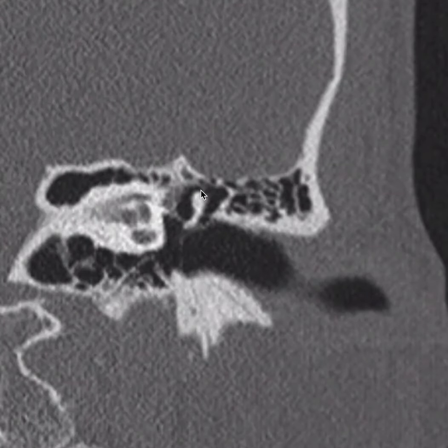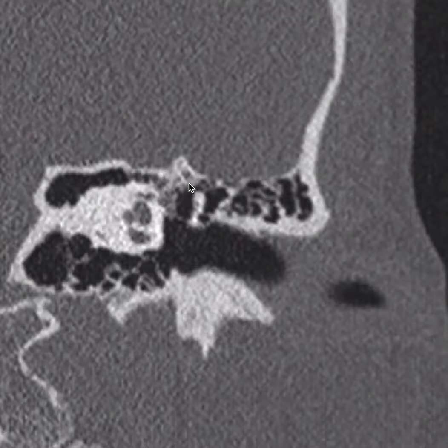Scrolling back anteriorly, another important area is the anterior epitympanic recess, which is just anterior to the cog. We'll see this better on axial view, but it will generally be in this area right here, anteriorly.